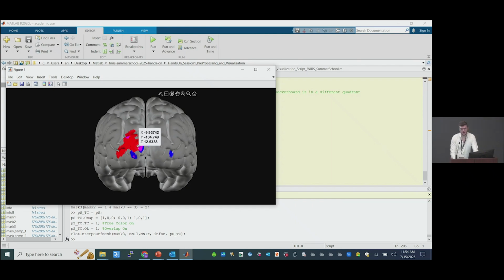And so I'm sure you're asking, what's the point of this? This doesn't seem super useful in terms of visualizing 2 different time points, but what it can be super useful for is, let's say you have data in terms of DOT, and then you also have fMRI data from the same participant. You can then create an overlap map, which we will see later today in Vita's slides, of our comparison between fMRI and DOT. And that can be a super useful validation tool for how well your model was made.